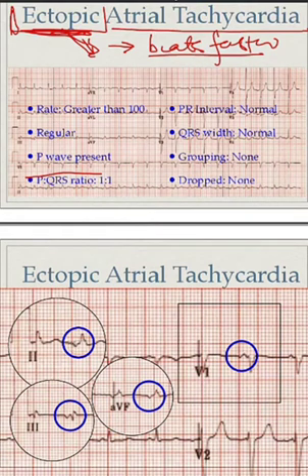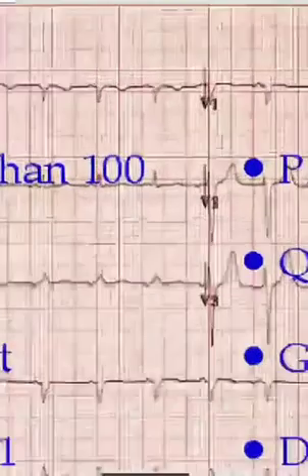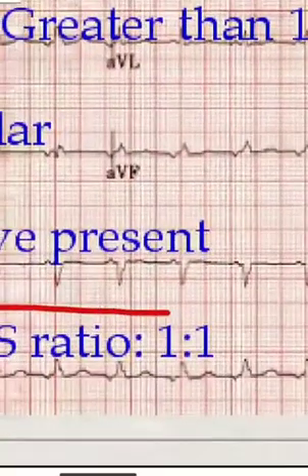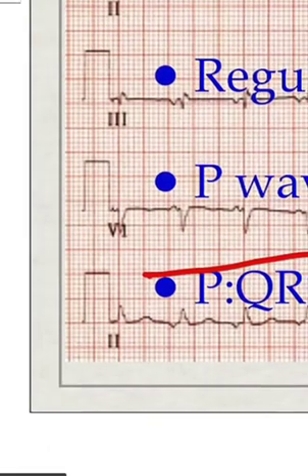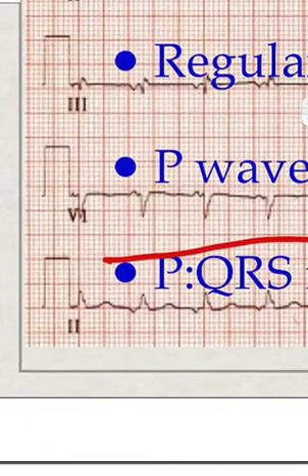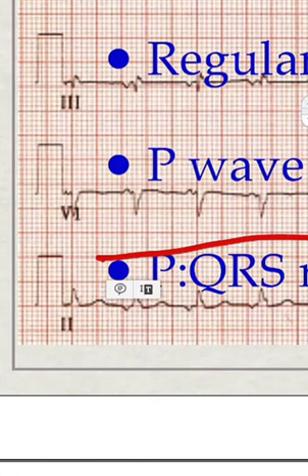Let's see the rhythm. P wave is inverted. Which, when P wave is inverted, what does it mean? It means that current is not following the same axis which it was. If this is our heart, and if from sinoatrial node towards AV node, P wave is positive. But if it is not coming from sinus node, it is here, and it is going towards the atria, the P wave is going to come inverted, as you can see in the figures, right?